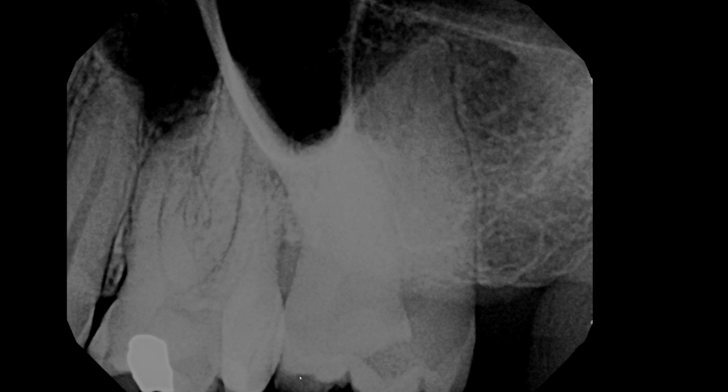But as far as why this would be located even more mesially than the second molar, I have no clue. It just sometimes erupts this way. But what's going to be really helpful is looking at the patient and examining clinically. When you look at the clinical crown, and if you ask the patient, you could probably easily figure out which one is the second and third molar.